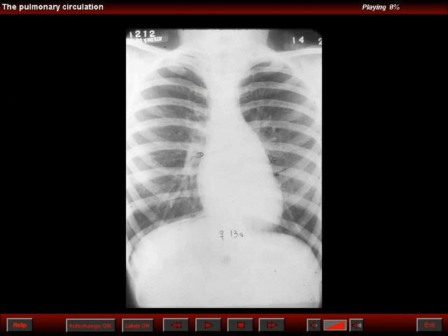Prominence of the middle third of the left heart border is not always an abnormality of clinical significance, and not always does it represent an enlarged pulmonary trunk. This is a patient with the so-called pseudo mitral configuration. That is a heart that is not enlarged, with a small aortic knob and a convex middle third of the left heart border. However, the pulmonary markings are radiographically normal.